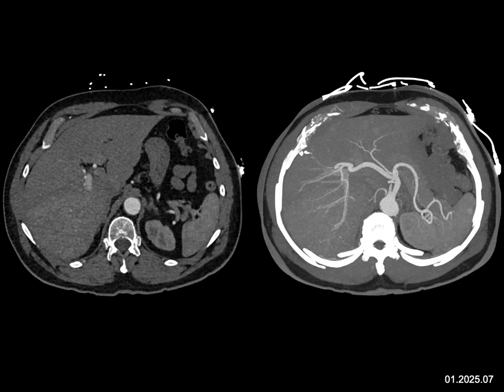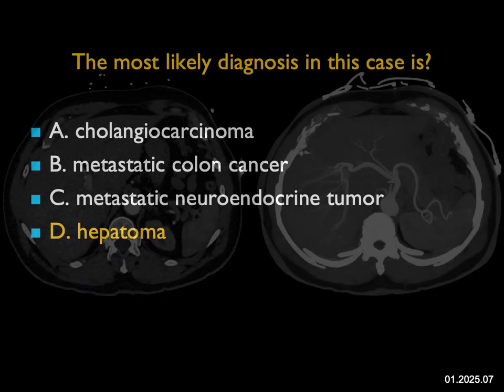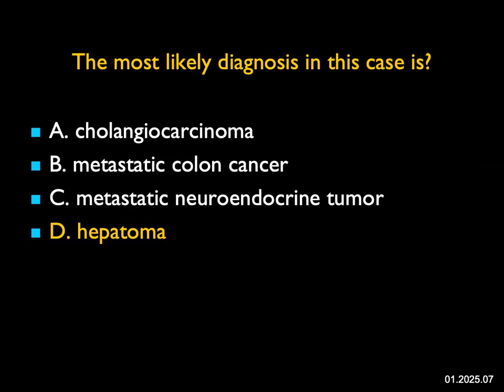They can present with a solid mass in the liver, but usually it's multiple lesions. I don't see anything else, so I don't like that diagnosis, but it could be a possibility if I told you the patient had a carcinoid of the terminal ileum. But with nothing else beyond the liver, this mass is consistent with hepatoma. The majority of hepatomas, up to 85%, are hypervascular, more common in cirrhotic livers, though the liver does not look cirrhotic in this case, but they're typically hypervascular with prominent vascularity, and so the most likely diagnosis is hepatoma.